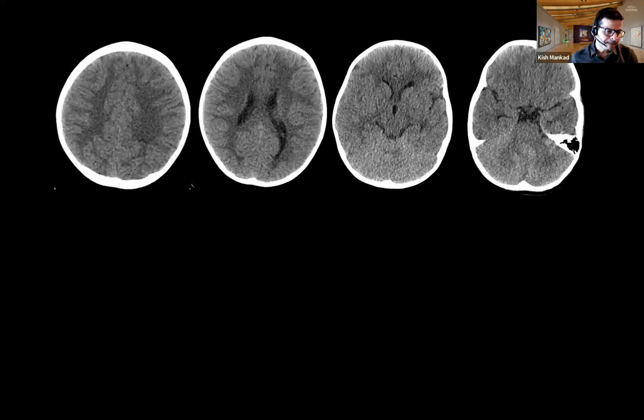And the clue here is that you do not see what you cannot see. So, what is it that you cannot see? I'm going to put that in the chat. What is it that you cannot see?